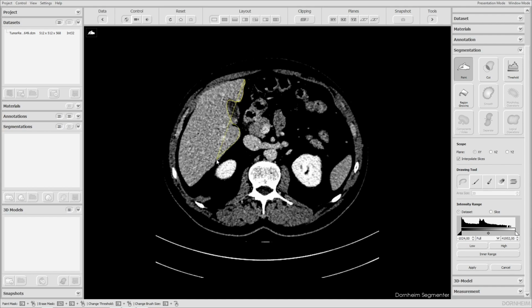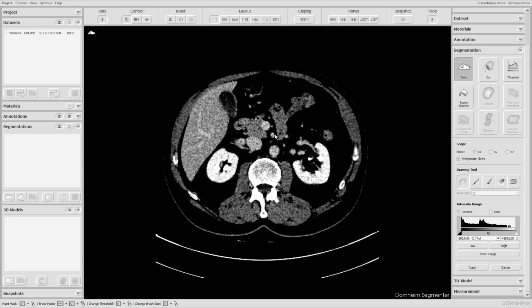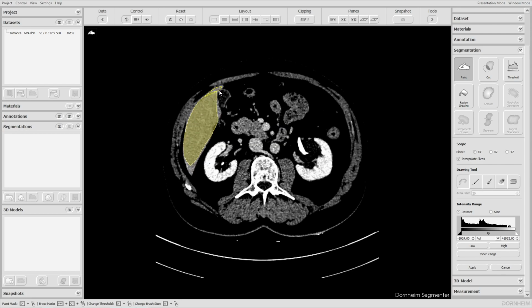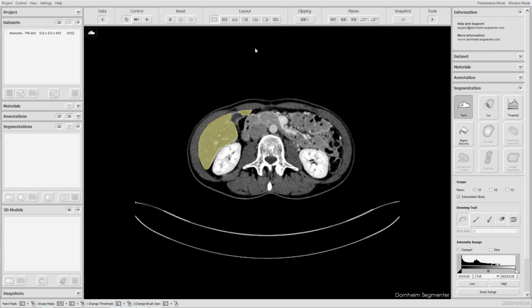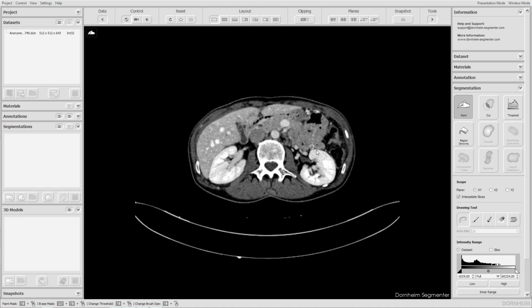We can see that the masks that we draw have a different brightness compared to the ones that have been interpolated, so if needed we can further modify those that we did. And that way we will obtain this organ by drawing only a few but correctly selected planes. If we identify that any of the interpolated planes is not exactly what we want, we can correct it, and again automatically the rest of the interpolated planes will be corrected.